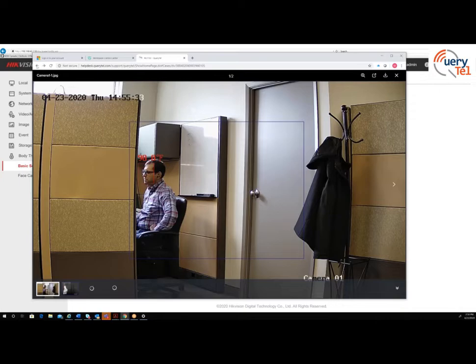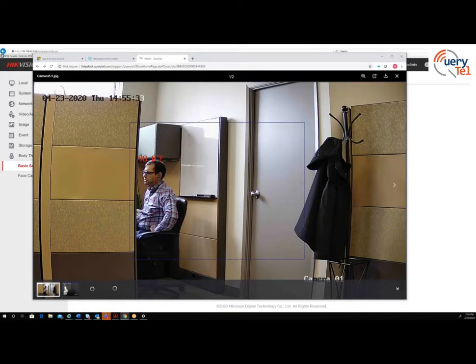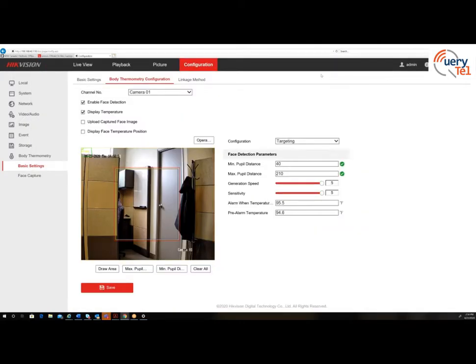And whoa, one more thing I forgot to do: we have to calibrate. So we didn't do the calibration yet. So it's showing 98.8, which is close to a fever rating. Okay, you know what? I'll bring back the screen and scroll down here. So here's what I'm going to do.